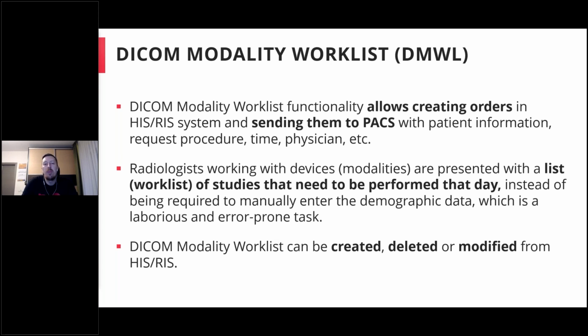So instead of being required to manually enter a patient last name, first name, birthday, and all the demographic information, they already have this information in a very convenient form, and they can just perform the study and send the study to the PACS.